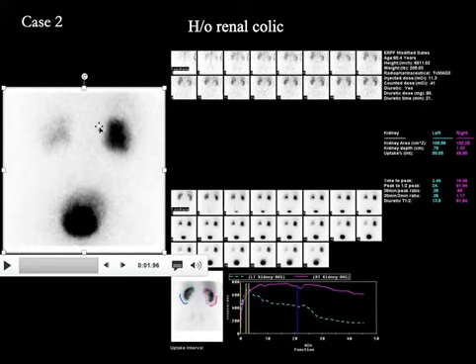Sometimes the technologists mistakenly draw just the cortex, which is incorrect. Sometimes they do not include the entire renal collecting system, or the ureter if there is any stasis in the ureter. When we are evaluating response to Lasix, we want to see the response to Lasix to the entire area of obstruction or stasis. So make sure that the region of interest is drawn correctly.